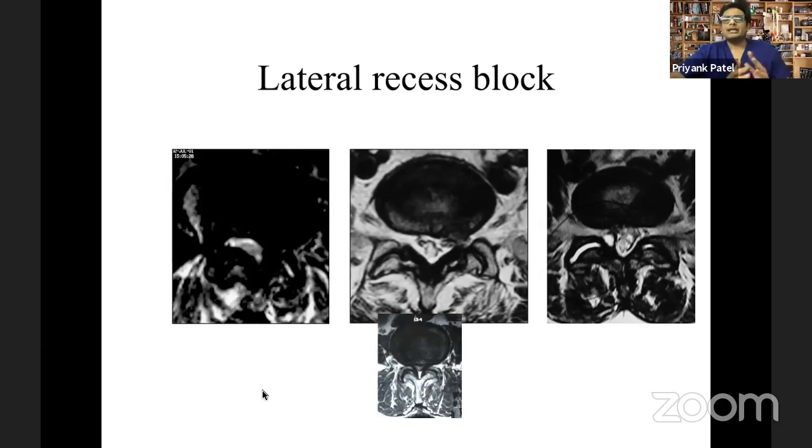So this is basically how you go about reading an MRI. Now MRI, as I told you, you just pick up the T2 weighted images, because T1 weighted images, stir images, coronal images, contrast images basically add value to your MRI. They help you differentiate between different conditions. But if you are able to just read the T2 weighted images, you will be able to cover 80 to 90% of all the conditions. All right. So don't get too confused. This is a practical bit that you pick up.